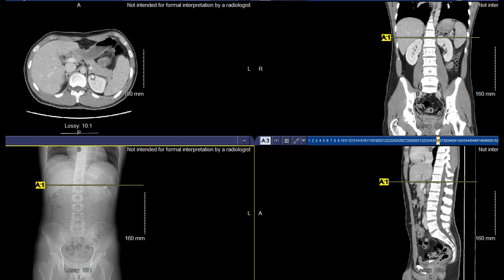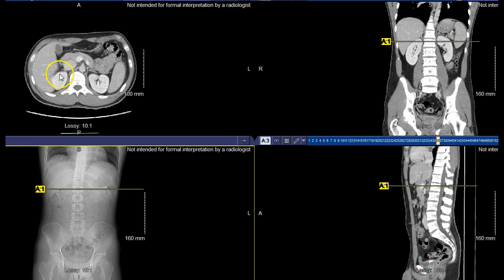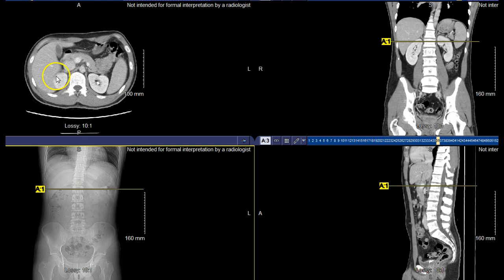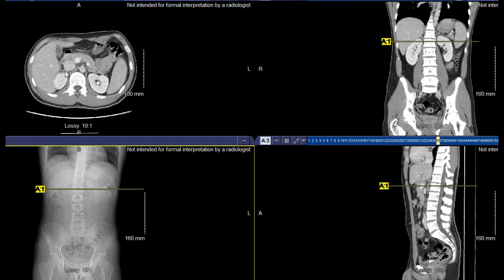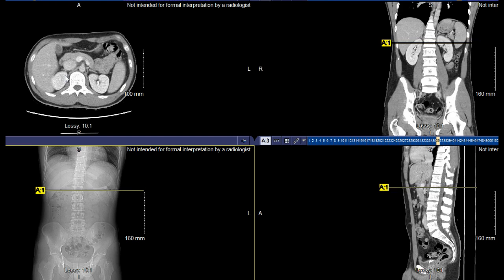So the left adrenal there, still see it, still see it, still see it. And then if we look here on the flip side, follow the crus, see that right near the crus is this structure here. You can see the formation of the right kidney over here. So anterior to that, you can see the adrenal gland. So definitely on this particular scan, you can see the left adrenal gland a little bit better than the right adrenal gland, but nonetheless, you can see both of them there respectively.